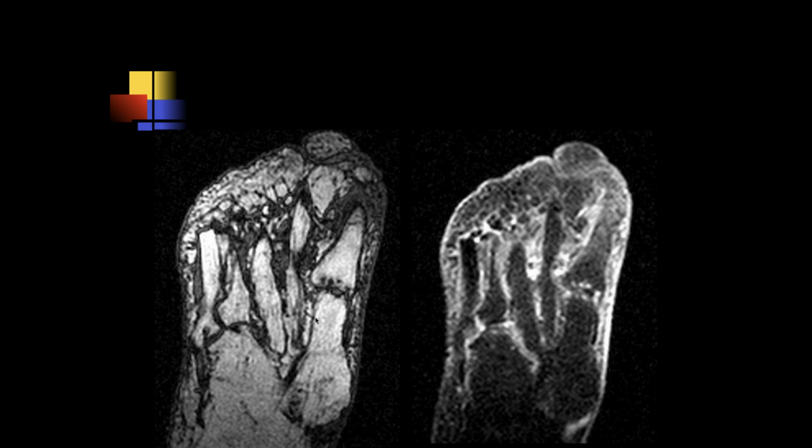So what is their history? Rheumatoid arthritis and foot pain. Okay. I mean, there's a lot of bony abnormality going on. I mean, right there, if you look at the lateral, where you're pointing out, there's fusion and there's extensive destruction and remodeling of the TMT joints. Just extensive fusion and remodeling and abnormal configuration. Yeah. And of course, whenever you have fusions like this, it changes the whole force pattern in the foot, which can lead to pain in and of itself.